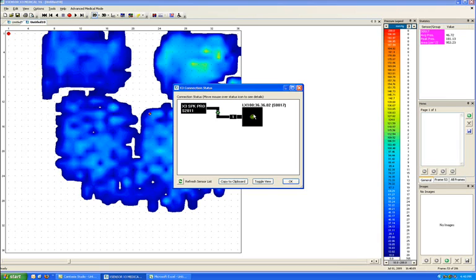From there it should usually work, but if not, call Xsensor Technical Support at 1-866-927-5222, extension 240. If at any point you reconnect, and then you wish to refresh the list, you can click on the lower left of this box, and it should refresh and show a properly operating system. If not, you can copy it to the clipboard, and then paste it into another document as a way of documenting where the fault occurred, so you can pass that information to Xsensor's Technical Support Department.